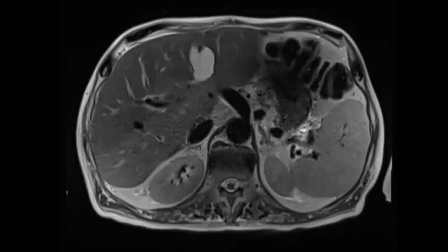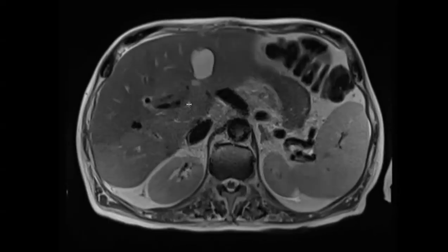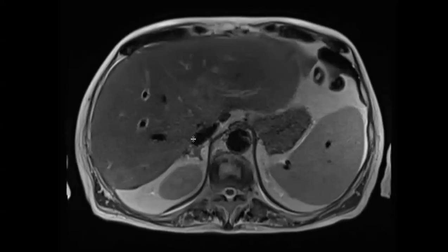And then the PET. It happened so fast. Yeah, within 3 months of transplant, we start to see this. So all of this, like you said, is an infiltrative, obliterating, progressive process. And then there's really high avid uptake.